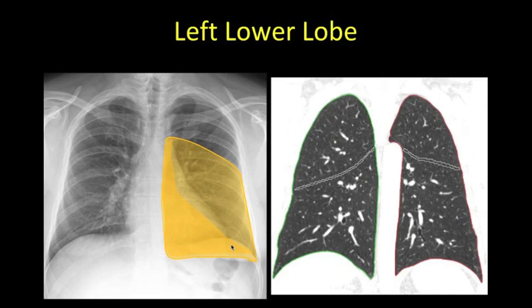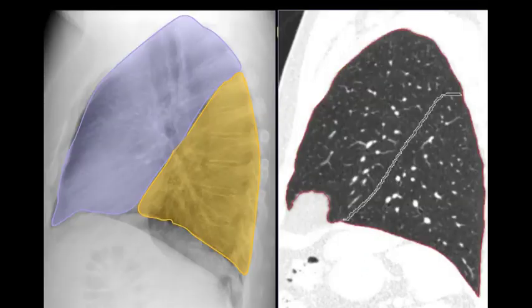The darker areas correspond to areas probably only in the lower lobe, extending medially to the border of the spine and beyond the top of the dome of the diaphragm. We can see, as on this schematic, overlaying a lateral chest x-ray, how the lower lobe extends beyond the level of the dome of the diaphragm and abuts structures in the spine behind the heart.